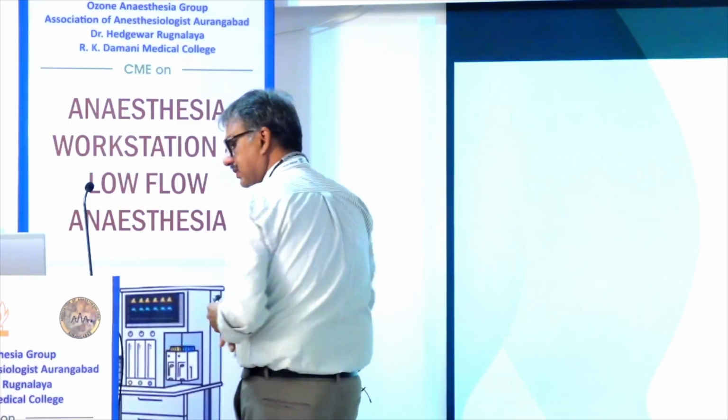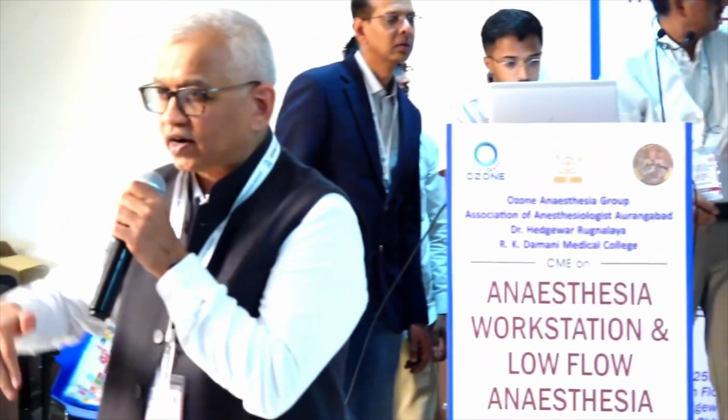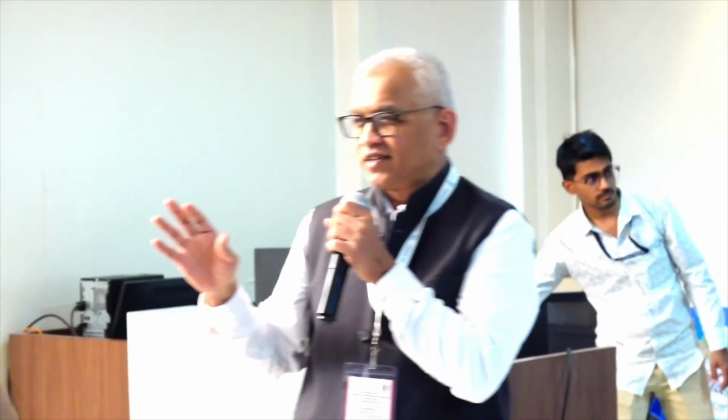The idea behind this exercise is that whatever way you are right now practicing, we'll try to simulate here and see how we can improve the efficiency. Okay. The idea is how we can improve the efficiency.